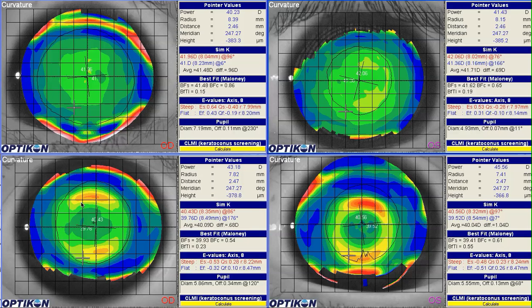In the right eye, it indicated in the case that the patient still has a full 2.25 diopters of myopia residual after treatment. If you do a quick difference map between these two, you'll find that you get a pretty solid area of 2 diopters of flattening. So I'm a little bit surprised that the patient is not appreciating any refractive change clinically, even though we're getting 2 diopters worth of anatomical change.